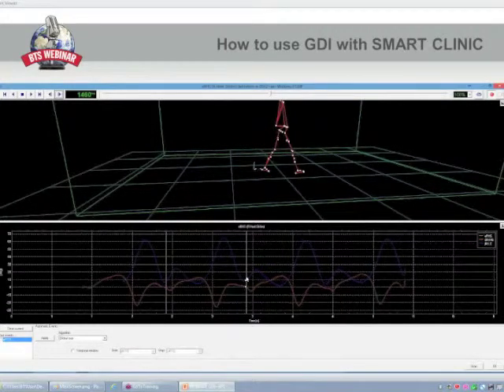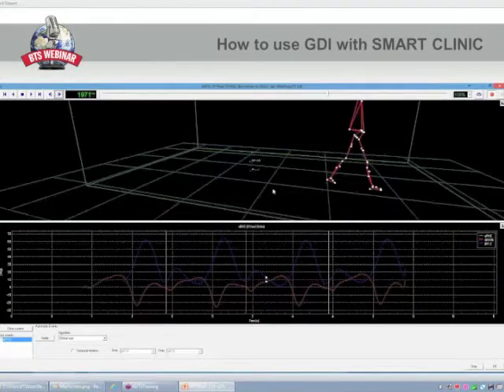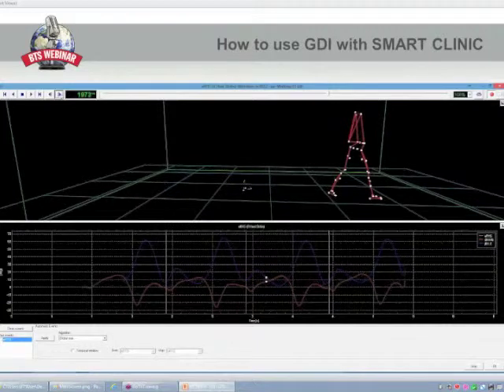Okay, as you can see, the vertical bar represents the desired event. Now I'm going to define the third right foot strike. So at the end we will get information about two entire right foot gait cycles. Okay, so this is going to be the next right foot strike.